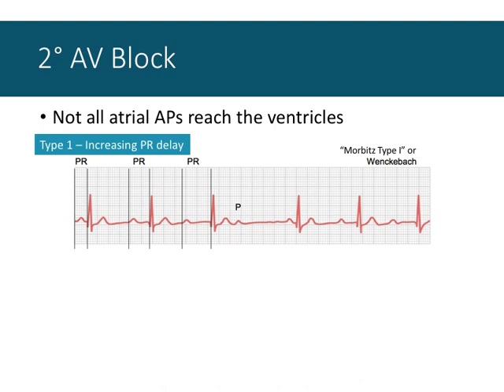our discussion there. So type 1, the most benign. This increasing delay will reset, and it doesn't aggravate the cardiac cycle any more than you see here. There's little chance of cardiac insufficiency or fibrillation or this progressing to anything more severe. There's just this increasing delay and the occasional skipped beat. And the most common treatment for this is just to install an artificial pacemaker, which will set the cardiac cycle and fix the PR interval.